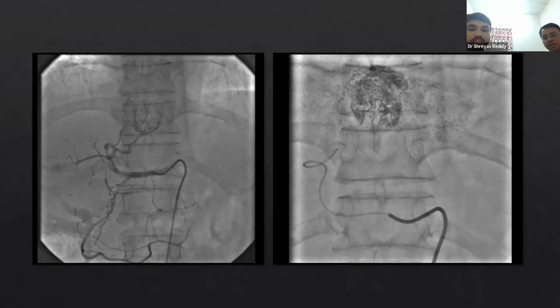Excellent. So now we have seen a case of transarterial chemoembolization. Do you know of any other condition that can be treated with transarterial chemoembolization? Liver hemangioma can be treated with bleomycin TACE, and also colorectal metastasis with irinotecan TACE. Okay. So what is TARE? Transarterial radioembolization, for inoperable malignancies which have invaded into the portal vein of the liver.